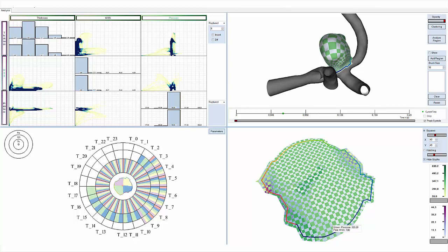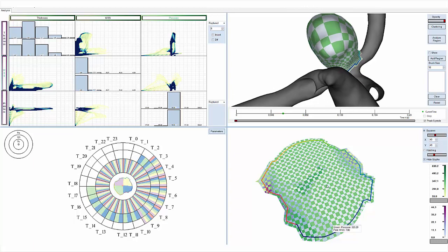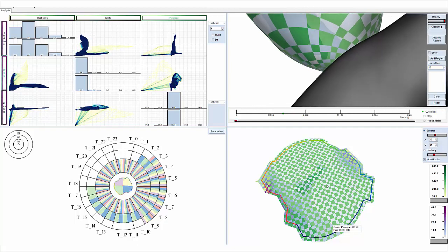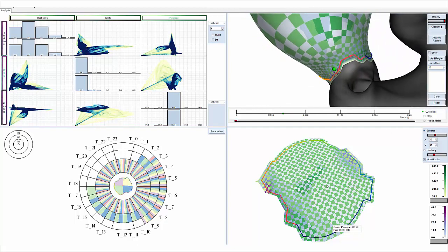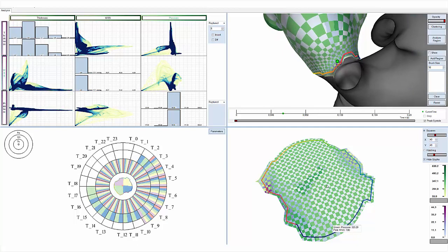Moreover, the user can pick a specific point in the map and the camera rotates automatically to the corresponding 3D position in a smooth way. In 3D, a green sphere appears at the corresponding position. Thus, interesting regions can be explored in 3D without a manual search.